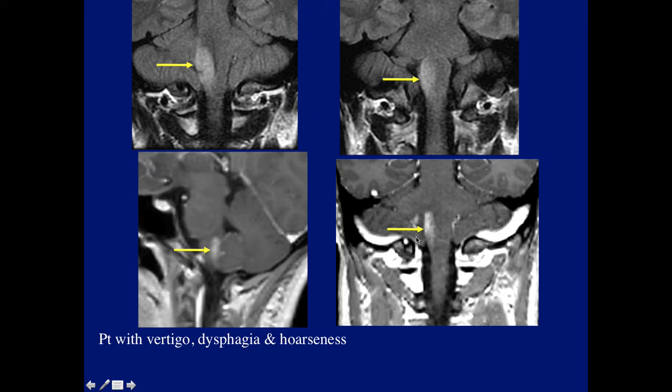Any suggestion for diagnosis? Not a bad possibility. Somebody mentioned MS, but it was not multiple sclerosis. Again, a disease I like to show every time. Correct. As Daniel and Asif mentioned, Lyme disease, or a variation. Not Lyme. This was ADEM, acute disseminated encephalomyelitis. Sorry, that was not Lyme.